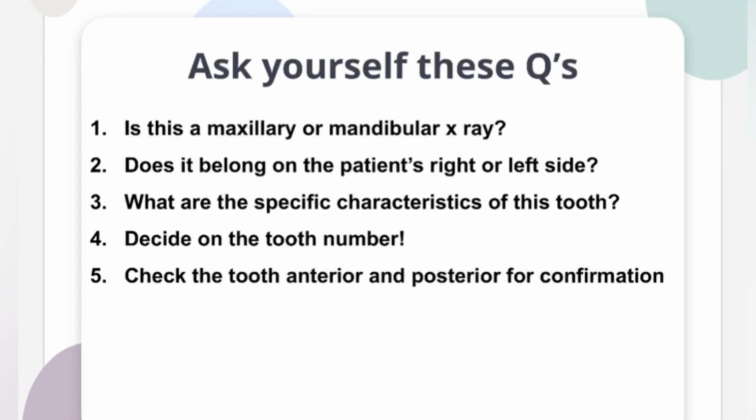And if it is still wide like a molar, you can then confirm, you know what, this is not tooth number 3, it's probably tooth number 2. So you have to look at what's in front and what's behind to help you decide, did you in fact make the right decision? And that right there is super helpful, and we'll go through some examples. Always referencing what's in front and what's behind is an amazing trick to determining if you decided on the correct tooth number. Okay, so let's get into it.